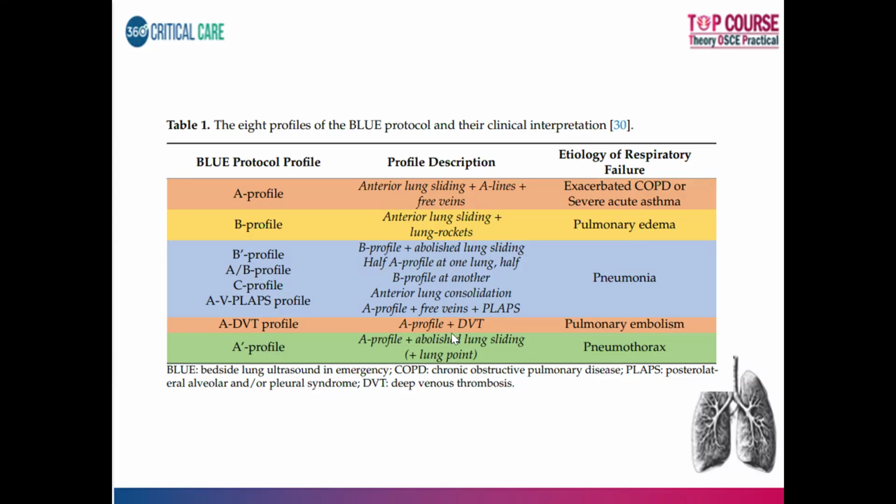So if you're writing your lung ultrasound finding in a chart, if you just mention it as A dash profile, then it is indicative of pneumothorax. Okay, so this is by and large the nomenclature of the BLUE protocol.